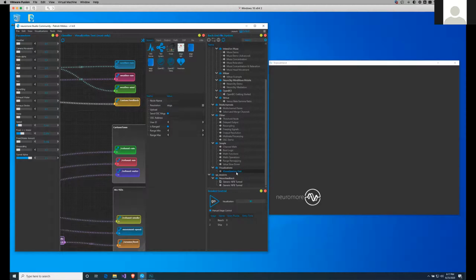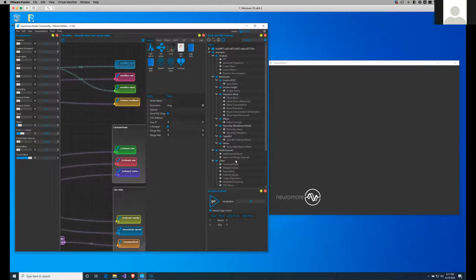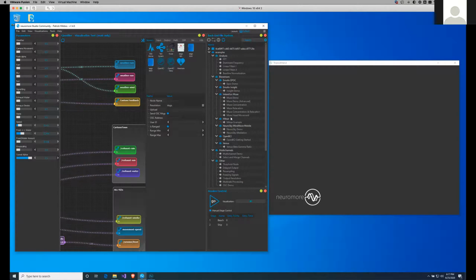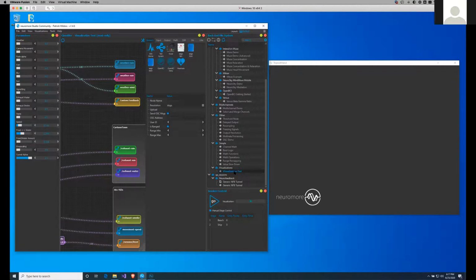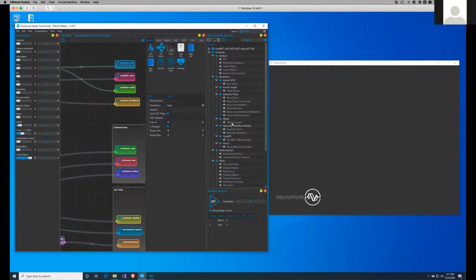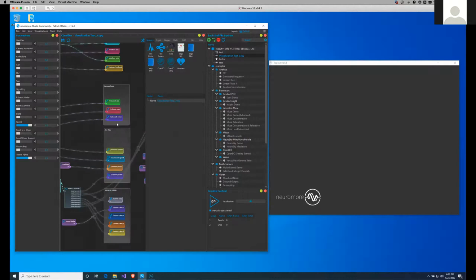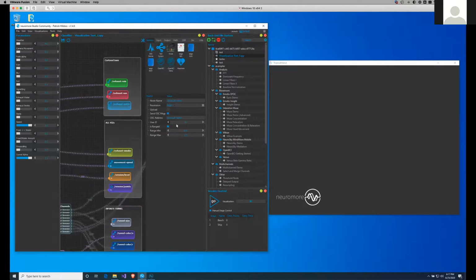Let me copy it to my personal folder, because currently you can see it's read only because those are examples. They're kind of like templates, and we don't want anyone to change the templates. But let's assume you want to change it for yourself. Then a neat feature that applies to all of those examples is that you can right-click on a classifier, and then there's an option copy to personal folder. If I do that, now I have a visualization test underscore a copy in my personal folder. And now it's no longer read only. And yeah, I can change whatever I want.